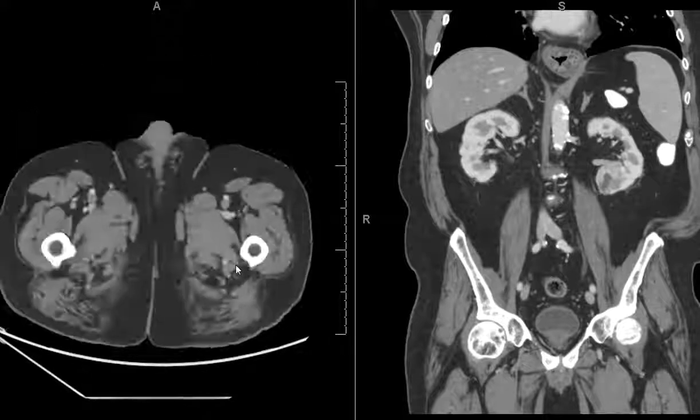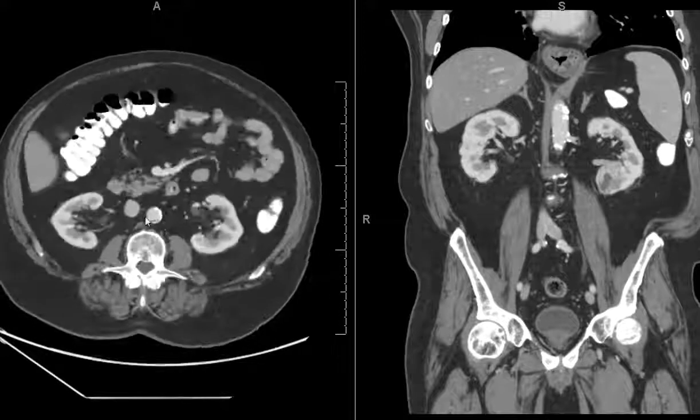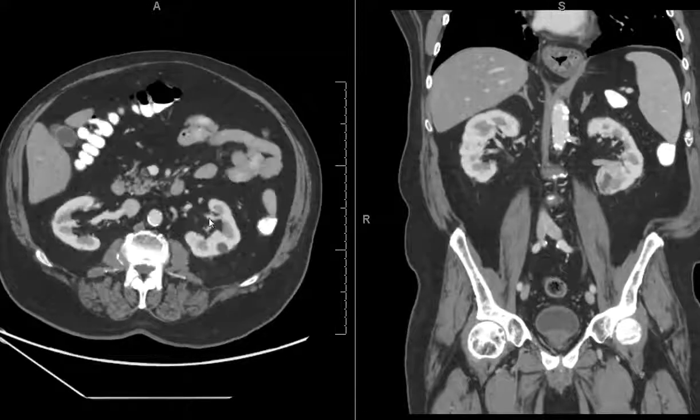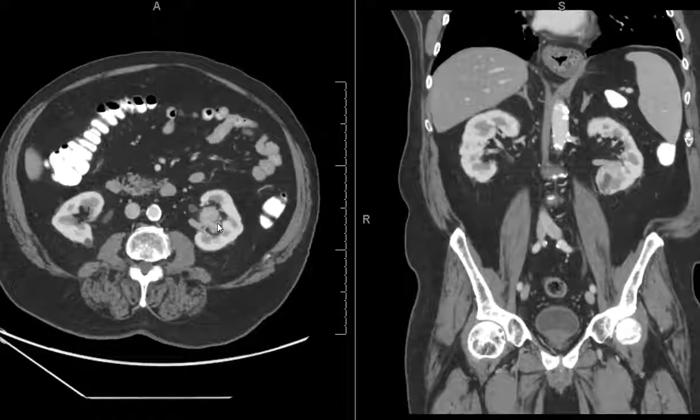After that, you want to see also if there is any renal venous thrombosis. So you can go, and this is the corticomedullary phase. You can see the renal vein here, and you carefully look at all the veins, particularly the ones which are supplying or draining the tumor.